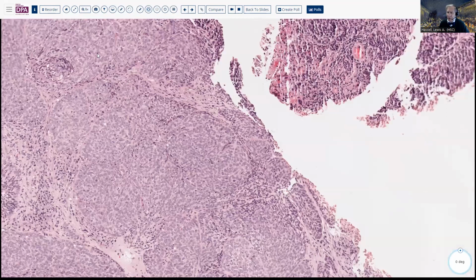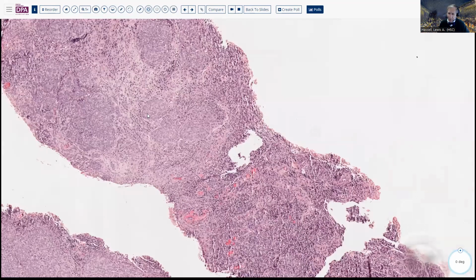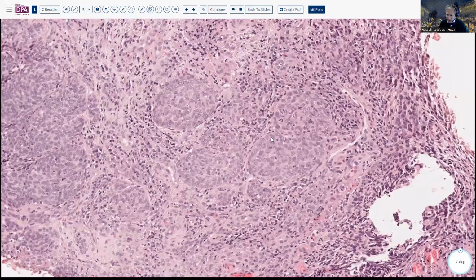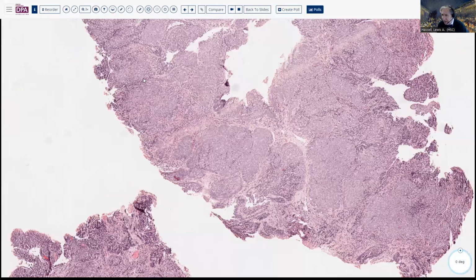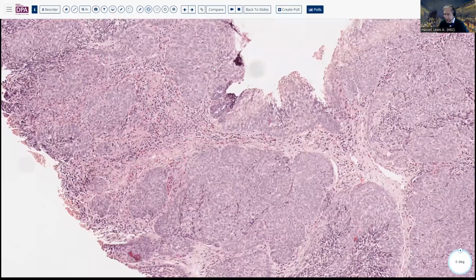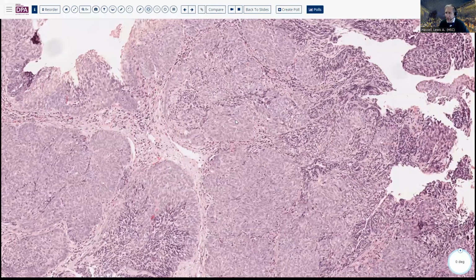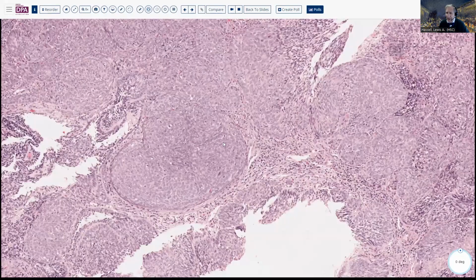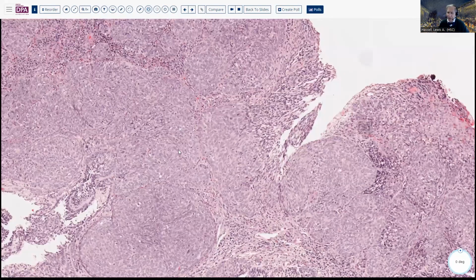We don't have any mucinous cystic or adenoid cystic type changes. I think we did see some pigmentation in one area of the lesion. Let's see if I can find that, which raised consideration of a melanocytic lesion. We didn't see much in the way of surface tissue here as well. So it can be a little bit difficult to define whether or not there's a surface element when it's kind of ulcerated and diffuse carcinoma like this.